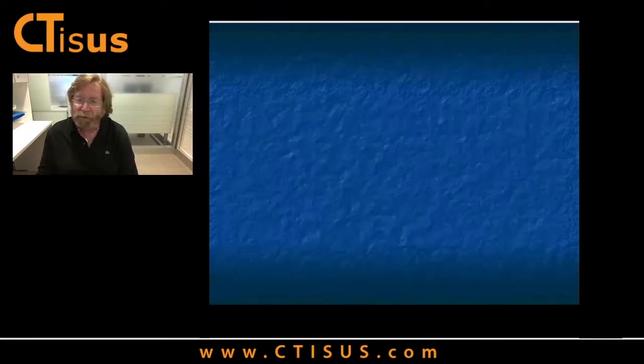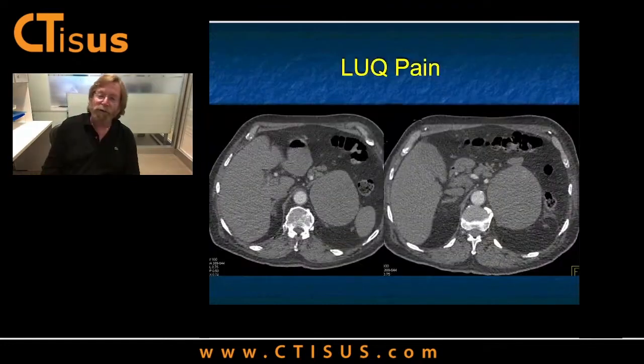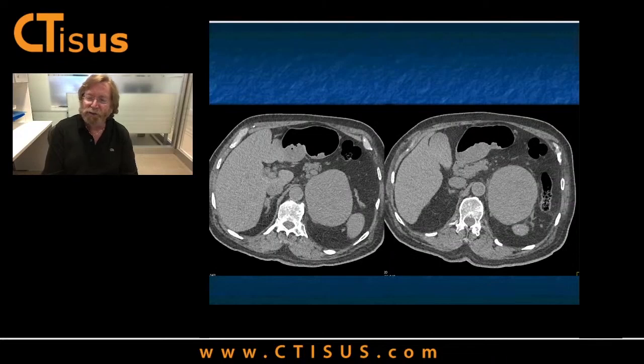Okay, let's go to another patient. And now I'm giving you another mass, left upper quadrant. Not quite as big as the last one, but pretty close. But it's solid, but it's not enhancing. You don't have that same vascularity as you saw in the other case. But again, the contralateral right adrenal looks okay. What am I dealing with? ACC is a possibility. Pheo, okay. Metastasis, okay. But I gotta be thinking of a solid mass.